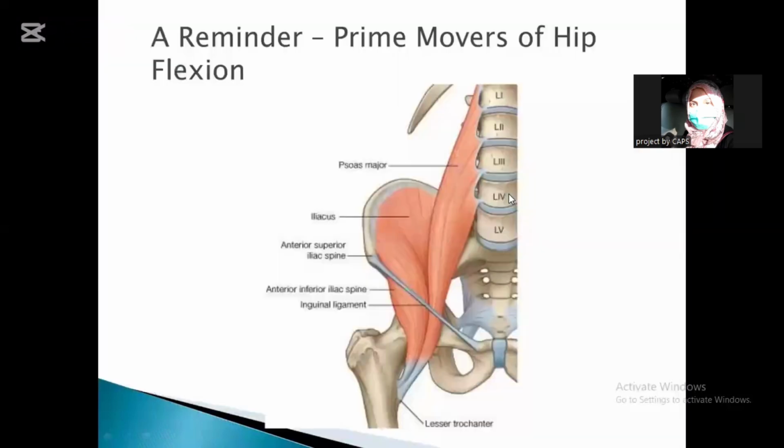And now I will zoom in for you. I'm zooming in on the upper anterior compartment. This is the iliacus muscle, this is the psoas. The main thing is you can see their origin here, and their insertion is in the upper part of the femur. So these are very important muscles, covered by the fascia iliaca. As you can see, this is the anterior superior iliac spine, and over here is the anterior inferior iliac spine, and the inguinal ligament is stretching between this and the pubic tubercle. Your nerves, artery and vein usually lie here.